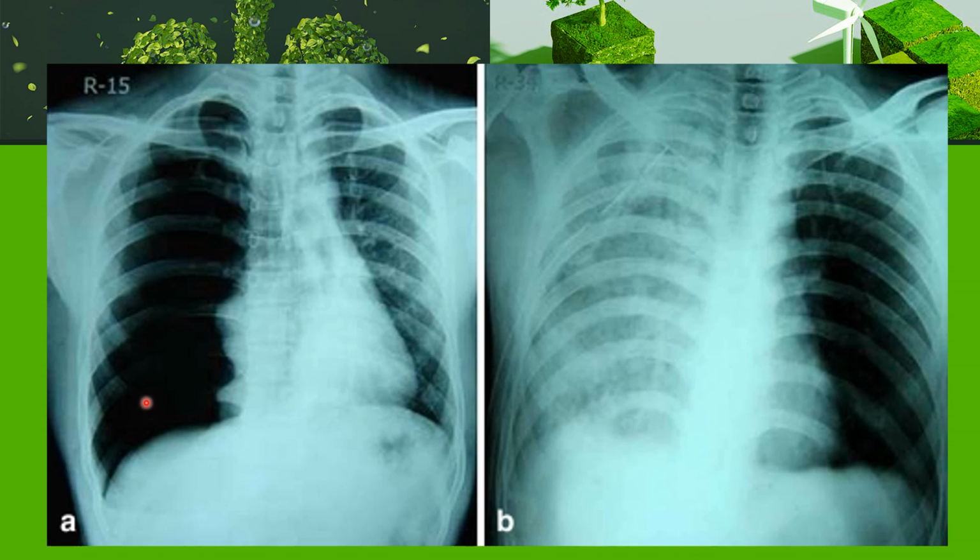Once evacuated by the chest tube inserted, the air is immediately pulled out of the pleural cavity into the drain, the lung expands immediately, blood flow re-establishes, and there is unilateral or asymmetrical pulmonary edema here.